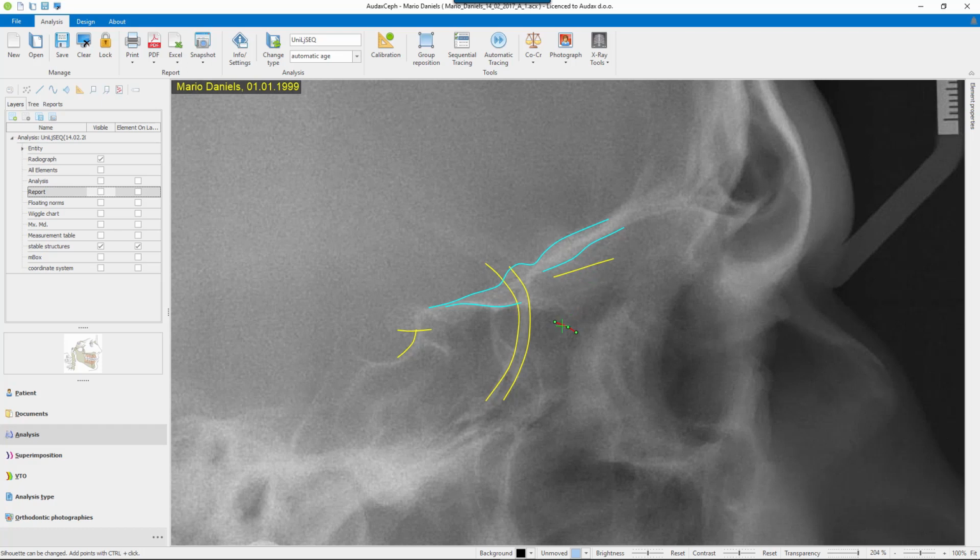The lower line, which is sometimes continuing from planum, is difficult to see, and you can see that I don't know actually where it is. This probably. The superior line represents ethmoidal crest, and this crest should always be visible. It's not very good visible, but okay, here it is, and we'll use that later. The most superior radio-opaque lines that are visible above the ethmoid bones are the cerebral surfaces of the orbital part of the frontal bone. They typically appear somehow disorganized.